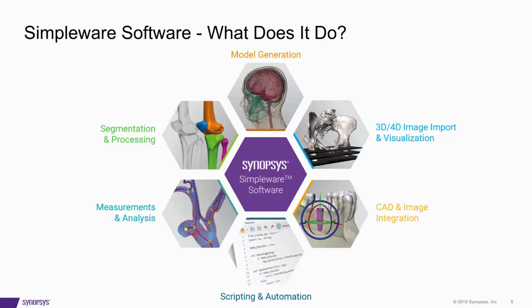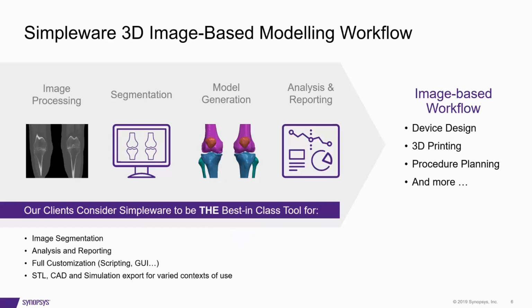Now, although the process that I'm going to talk about today focuses on a single patient-specific process, this could be fully automated to process many, many more patients with little or no user interaction by using a combination of our AI-based segmentation modules and also our scripting capability. So now we're just going to focus on the Simpleware 3D image-based workflow.